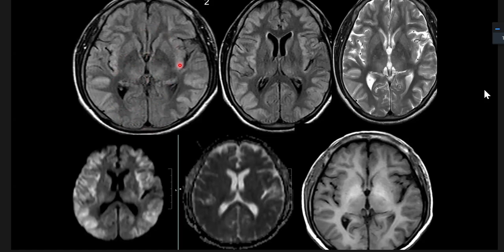Hepatic encephalopathy. Very good. Why does hepatic encephalopathy have a preservation of occipital lobes? Is any other lobe preserved in hepatic encephalopathy showing so much cortical swelling? The occipital lobe is spared, do you agree? Cerebellum is too, as you said. Okay, that is fine. Another peculiarity: the cerebellum will be spared in all the process till the end, because the posterior circulation will be preserved till late stages.